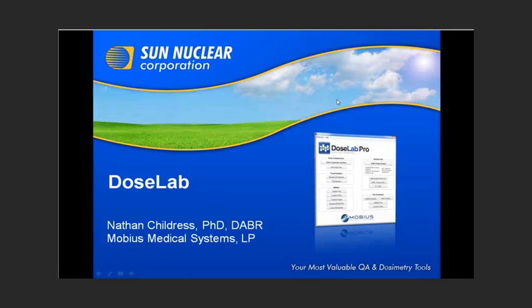And I'm going to start off today's webinar with a short presentation, and then we're going to get into using the software and seeing how it can be used for machine QA and film dosimetry.